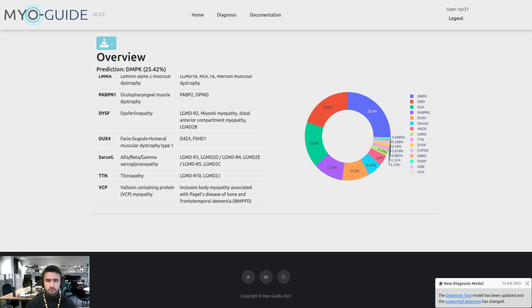Also note that the model can be confidently wrong, meaning that the model can be wrong even if the top diagnosis presents a 95% probability, and that the model can also be unconfidently correct. This means that a high probability could still lead to incorrect results.